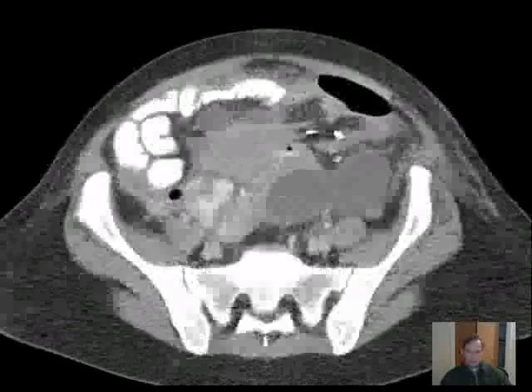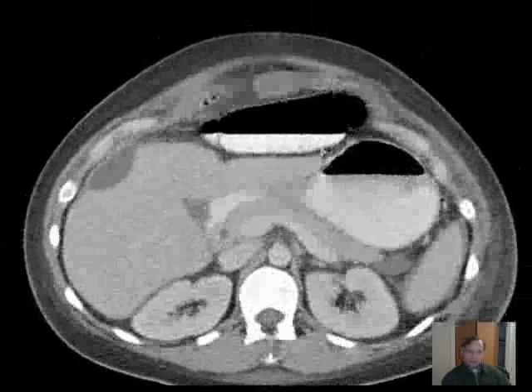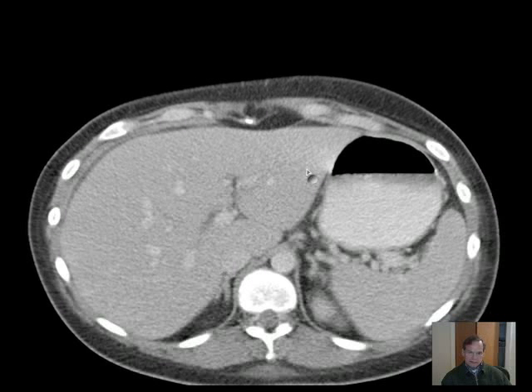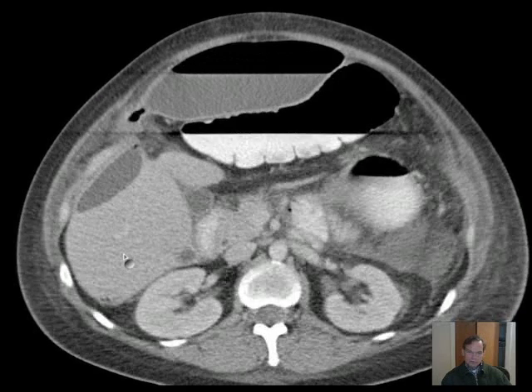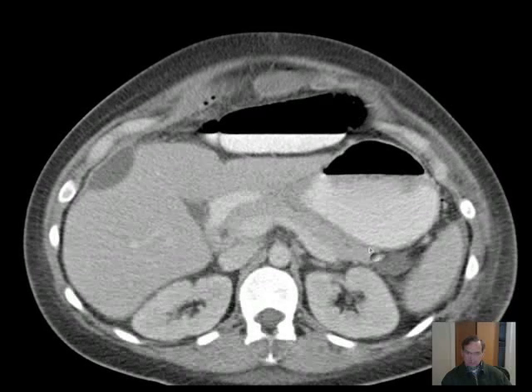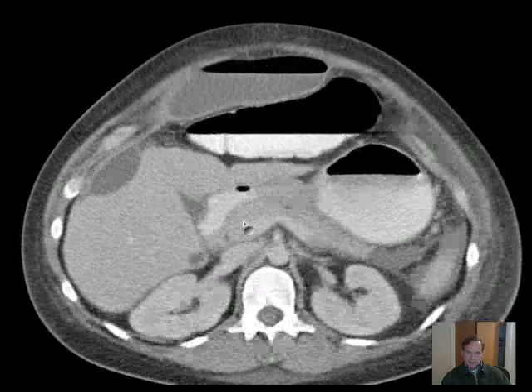Okay, let's first look at some of the structures that we know for sure. And good old liver is usually quite readily identifiable. The left lobe of the liver and right lobe are divided at about this area here. And so this is lateral segment and medial segment of the left lobe. And here's right lobe of the liver. You see pancreas here. That's pancreas.